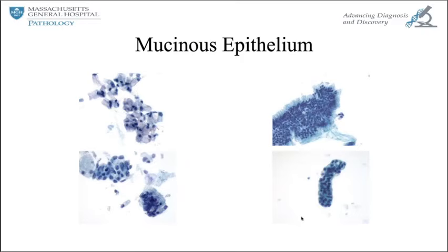Patient needs to be monitored. And then we can look in the background for mucinous epithelium. Maybe the mucin was thin and not appreciated. You couldn't tell if there was real extracellular mucin on your specimen. So then you go to look for the epithelium, and you look for epithelium that looks mucinous. You can see the mucinous compartment here, and you can see this kind of papillary architecture with this mucinous compartment. Here is more of a papillary architecture where it's rounded up and you can't see the intracytoplasmic mucin except for a few residual globules.